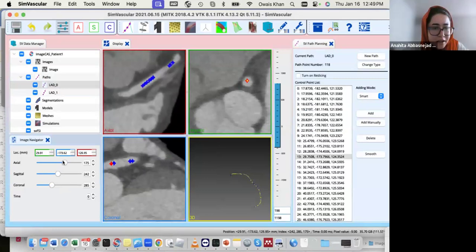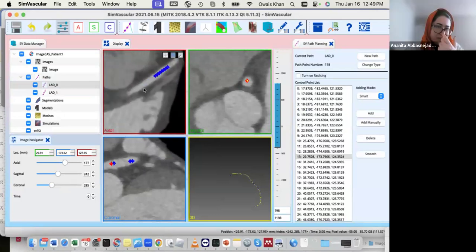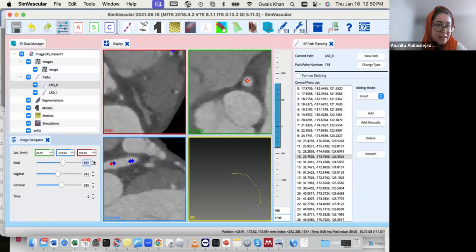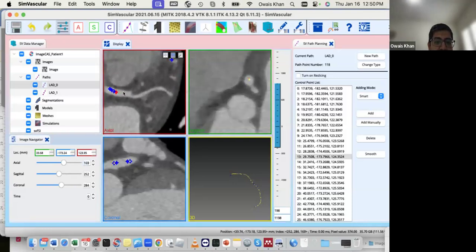And that was actually a diag. Oh, that's the diag. So where's my LCX? Yeah, it should be offered. Oh, it's here. You see? So this is... No, this is diag. Oh, this is my... that's LCA. Yeah, see, Anna, you're much better at it than I am now.